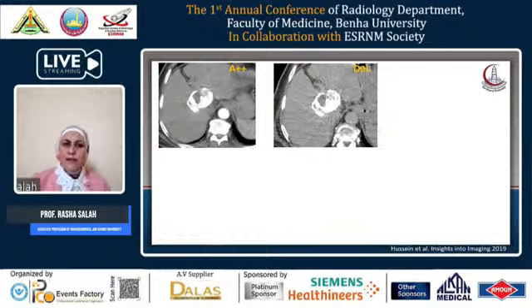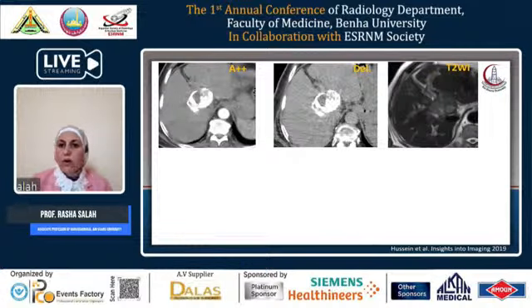And the patient was actually reported as a well-treated lesion with no appreciable enhancement, because it is very difficult to appreciate enhancement in such an artifact with the lipiodol condensation. But the patient has rising alpha-fetoprotein after the chemoembolization, and there was suspicion for residual viable tumor, so he was referred for MRI.